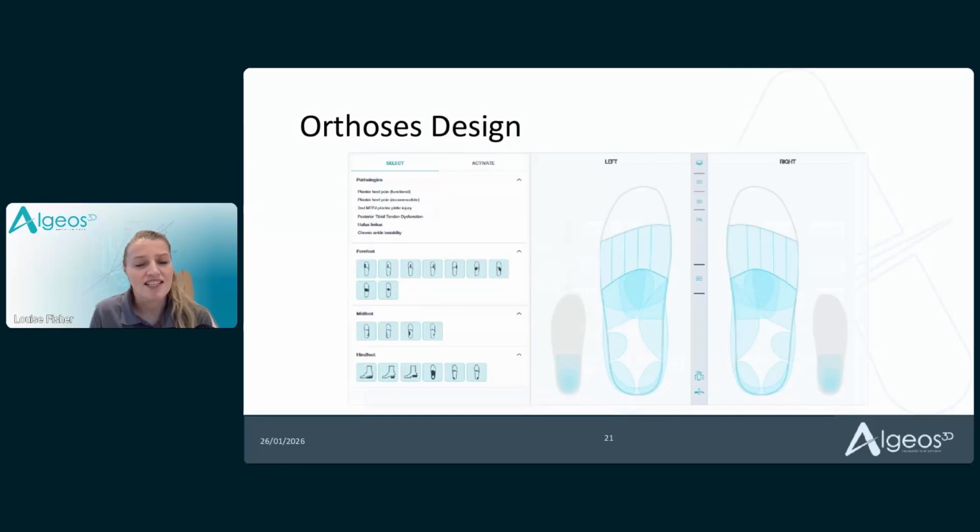And what this system allows you to do is literally look at that screen and pick the spec that you want. So you have a list of 6 presets here, which are all evidence-based specs. You click on one of them and it'll auto-populate the commonly used prescription in clinical practice for that pathology. You can take it on, take it off, you can increase it, you can decrease it, you can still fully control it, but it is just to give you a starting point of working parameters that we know is linked to certain conditions based on previous research.